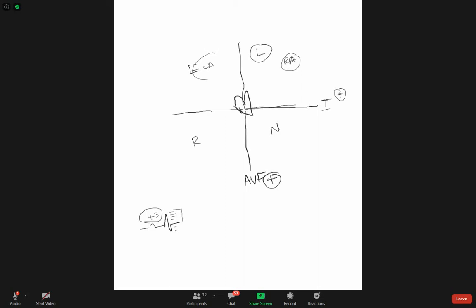Your R is bigger than your S. So this is a positive lead 1 or positive aVF. When I say positive, I'm talking about the QRS in the lead itself. If you're here, right? Then you have a normal axis.